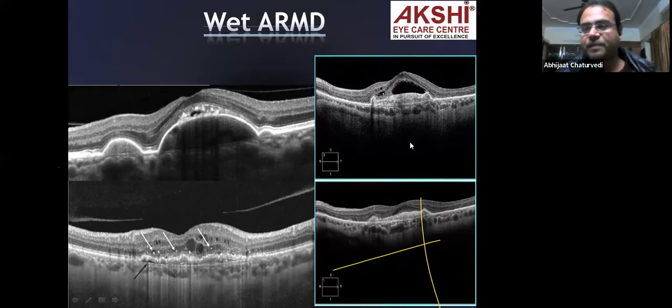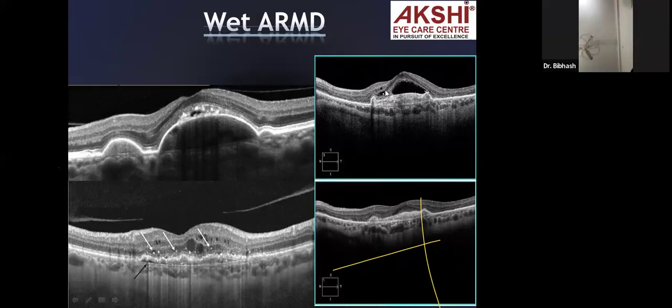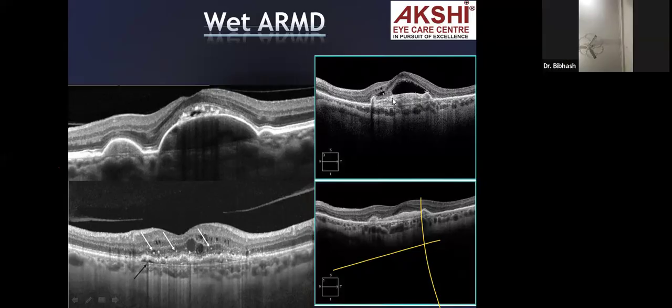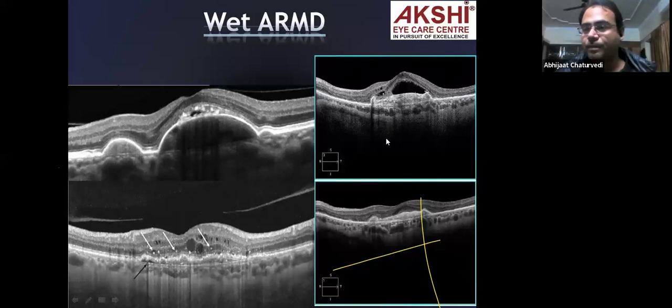This image I put for a specific purpose. It was an old patient, and the patient was injected for the removal of this fluid. Now the importance of patient education using OCT comes. You can show the patient that the fluid will go away after injection. However, this scar that is there, this CNV scar, doesn't go. It might slightly regress, but it won't go away. So your visual acuity will only slightly improve, not much.